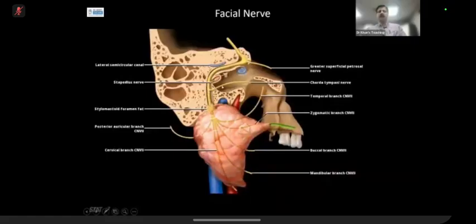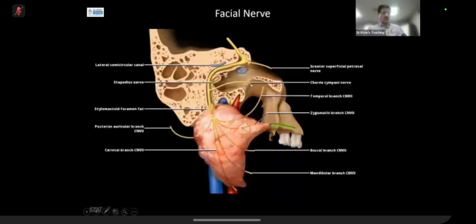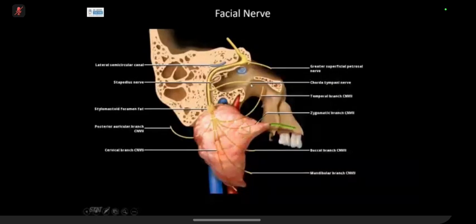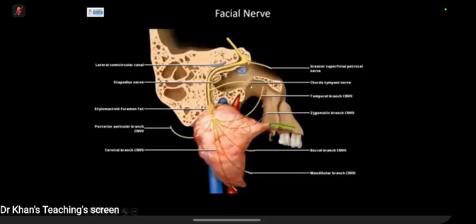There is another nerve here, which is known as chorda tympani, which on a CT scan, you can see on a sagittal sequence. It comes out and passes through. Chorda tympani supplies, what is the candidate to? Chorda tympani. What do you know about it? So it's the tongue. Yeah, good. Posterior 2/3 of the tongue. Anterior. It supplies anterior 2/3 of the tongue.